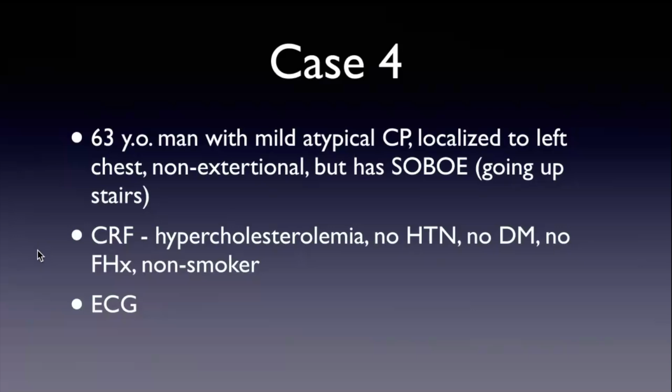Okay. Case 4. Had 6 cases. Okay. Try not to go too fast. Okay, so I'm trying to check if I've made the points that I need to make, at least from a technical side. Before I switch gears, although this one's a little bit related, any questions so far over contrast settings?